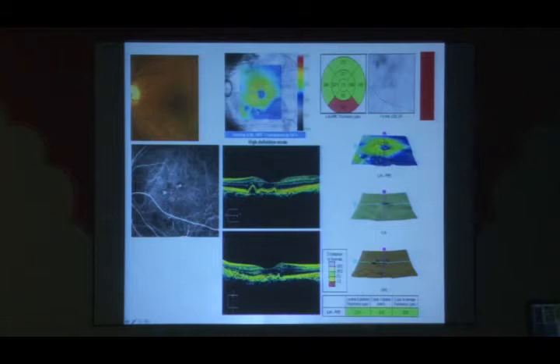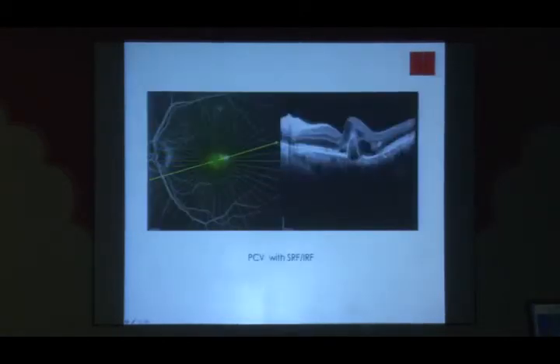And what you see here in this pigment epithelial detachment, just contrast the contents of this PED. I'm sure it's not blown up in good magnification, but it looks pretty clear. I compare that with this sharp PED, which is not clear. So this is more suggestive of a PCV, polyp lesion, rather than just a serous PED. So one of the differences is that a PCV causing a sharp elevation of pigment epithelium usually has more heterogeneity within itself than a simple serous PED.